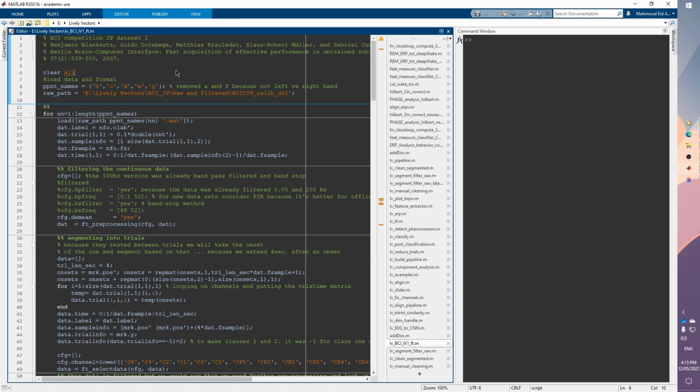It's a very nice dataset with motor imagery data, so people are basically imagining movements of the right hand, left hand, and also feet. I'm just using some very small samples, like some participants in this dataset. By the way, some of them were artificially generated, but this is really irrelevant in this kind of coding session. So anyway, these are actual datasets that we will be using in this session.